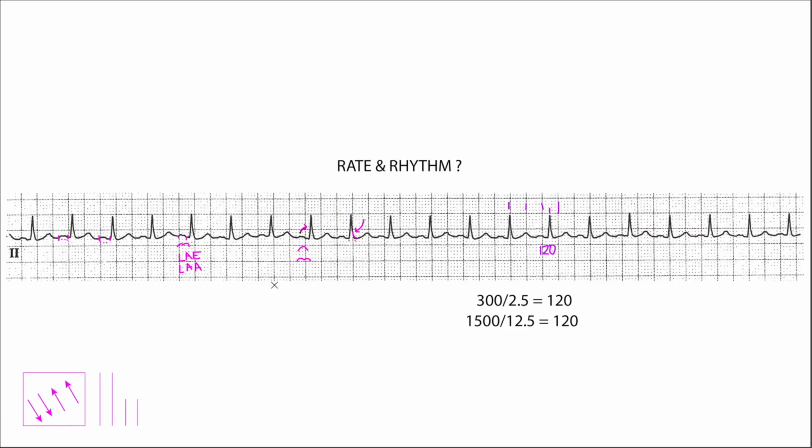So far, what we have here is potentially left atrial enlargement, a heart rate of 120, and no AV conduction issues.